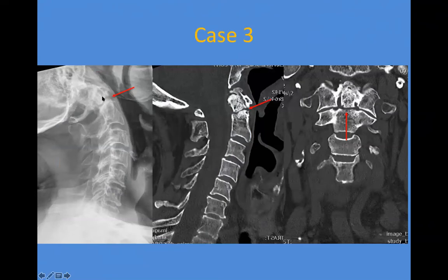And in fact, there's sclerosis on either side of the fracture line. And again, on CT scan, we see the same thing. Fracture line here, but sclerosis. What does that mean to you? That sclerosis. Osteoarthritis? Well, that's a good idea, but there's not a joint space here. And so when you see sclerosis where you're thinking there could be a fracture line, you have to think about a few things. One would be, is this some kind of anatomic variant, like an accessory ossicle that is a pitfall for me to think that this is a fracture?